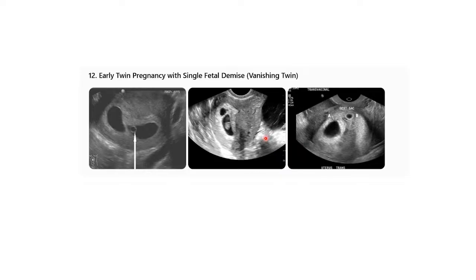So if you are not careful, you do your sonar, you see the twins, you tell your patient that these are twins, but later on when they come, you see that it's one. So you are going to be seen like someone who's incompetent. You must know that there is what is called the vanishing twin syndrome, a sign of pregnancy failure. Then the other one may have probably vanished. That's what a professional does.